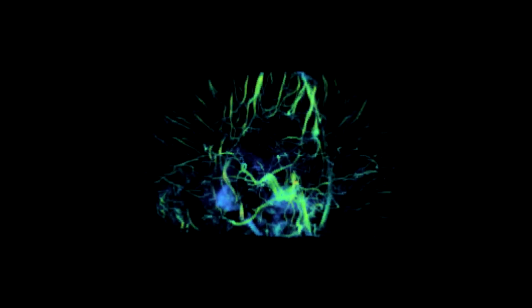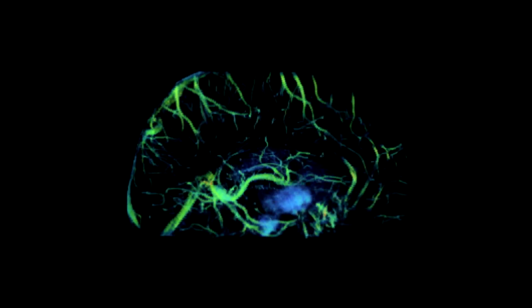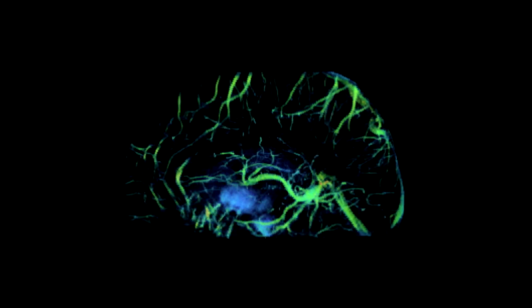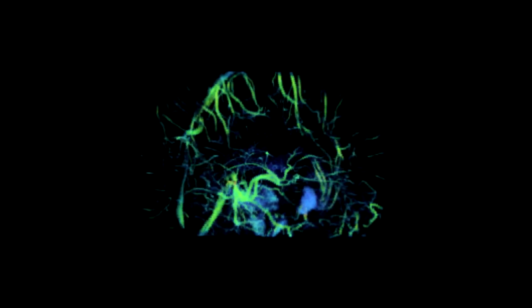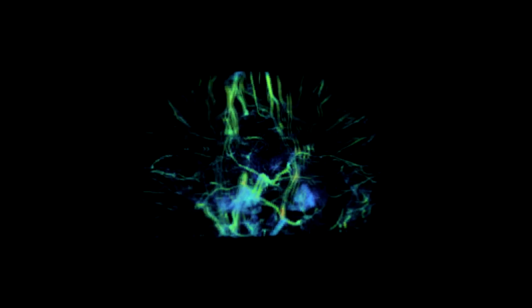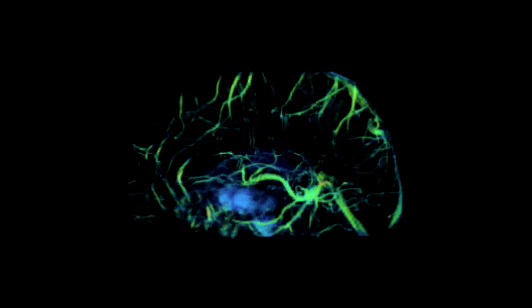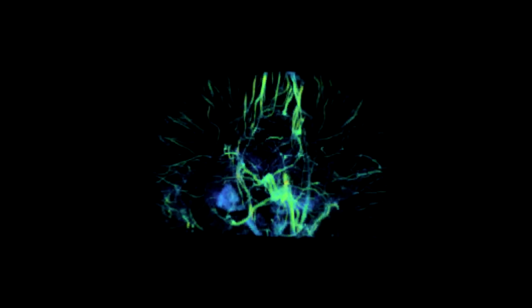So finally, the final image I have here is an example of a whole brain SWIM image. The green represents the oxygen saturation levels in the veins, and the blue represents the iron content in the basal ganglia. And in principle, if we could image a stroke patient like this, a traumatic brain injury patient like this, these 3D images will show us all the areas that are compromised due to bad flow.